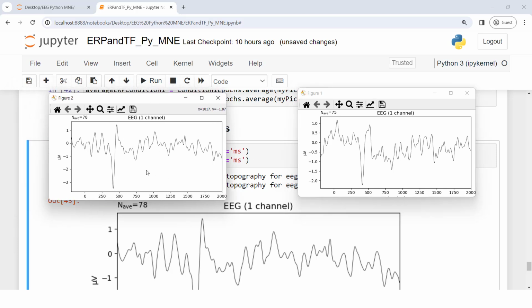Note that these deviations seen in the signal would be smoother if, for example, there were 30 participants, similar to what we discussed in theoretical discussions. Usually ERP analyses are conducted in intervals shorter than 2000 milliseconds, and shorter intervals are considered for a specific analysis. For instance, for the P3 component, a time interval between 250 to 500 or 600 milliseconds is often considered.